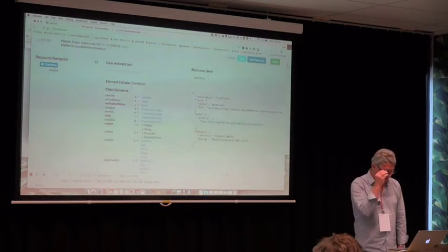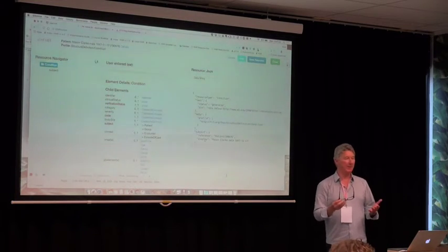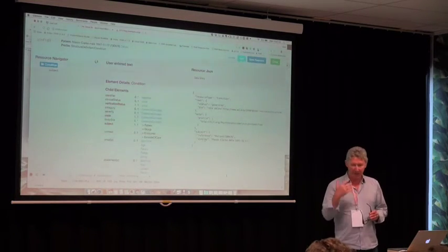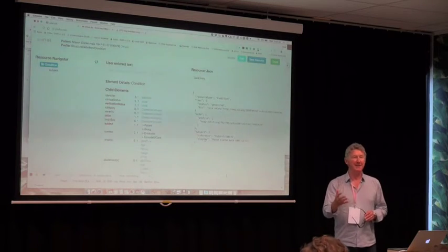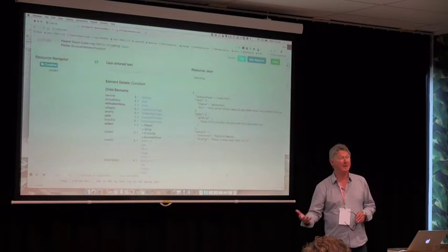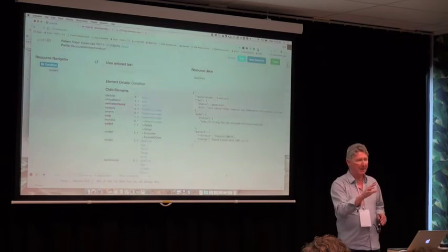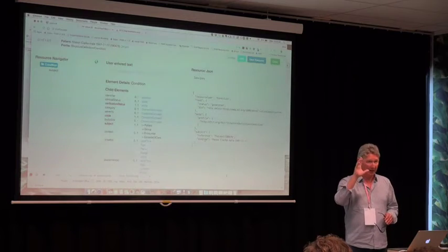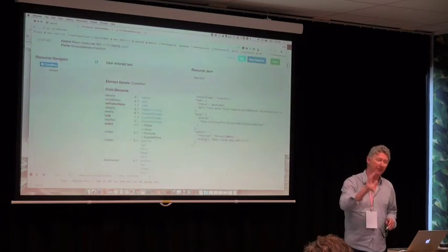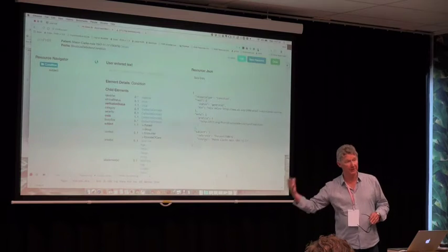Now, I mentioned in the talk this morning that one of the nice things about the way FHIR works is that because everything's computable, it's possible to write interfaces that work directly off those computable artifacts, which is exactly what clinFHIR is doing. So the tooling has gone away, downloaded the structure definition resource which defines what a condition looks like, and used that to build this interface.